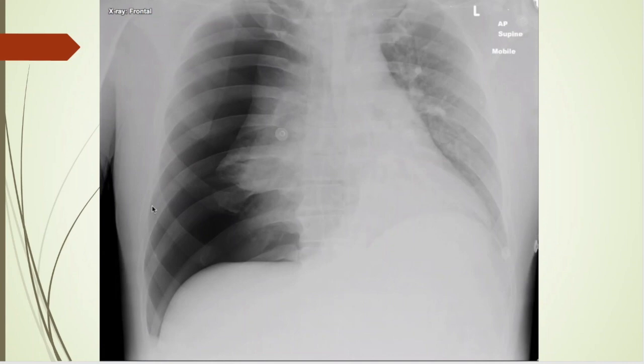Now here's a nice one. So let's start from the beginning, although you can't see a whole heck of a lot, can you? So it's cut off, so that kind of hurts. I'm trying to find the trachea. I think I kind of sort of see it maybe here. Maybe this is a carina. In any case, it appears to be shifted over to the patient's left quite a bit, which is kind of concerning, right? B for bones, that's okay.